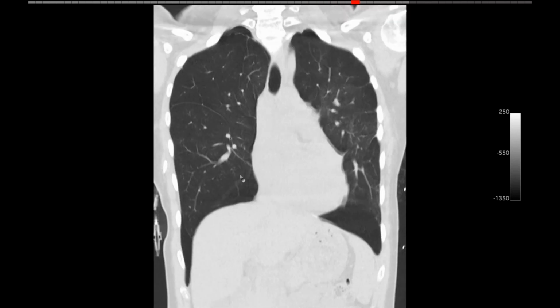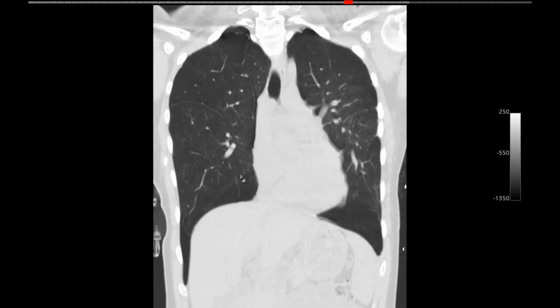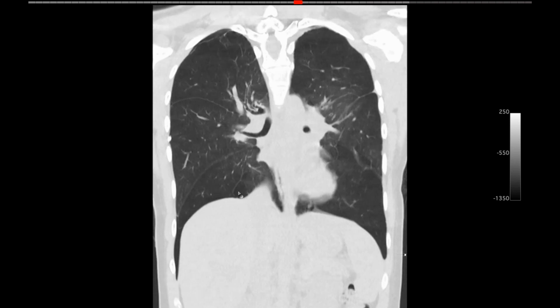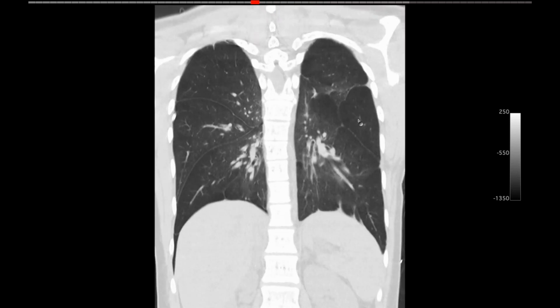I wonder what the histology is, whether this is constrictive bronchiolitis under the microscope. Yeah, I don't know. One would think the airways are probably abnormal, because these areas of lung are so abnormal. They seem to be hyperinflated. They've got vessels in. They don't have discrete cysts in.